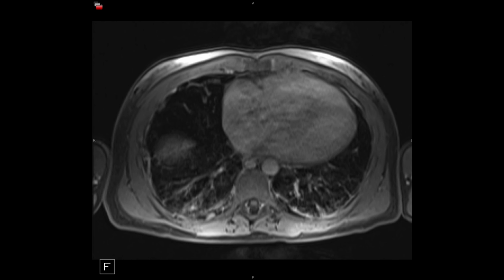And again, there's a gray zone, there's a spectrum of patients who have chronic PE, no pulmonary hypertension, but persistent symptoms, which is an entity known as chronic thromboembolic disease, versus the patients who truly develop pulmonary hypertension from chronic PE. And in those patients, you're going to see peripheral or these sort of eccentric filling defects within the pulmonary arteries. They may calcify over time. You'll see webs. You'll see vascular pruning. In other words, fewer vessels in a segment of the lung than you would expect. Mosaic attenuation. If you do perfusion imaging, you'll see perfusion defects. And, of course, the evidence of pulmonary hypertension within the cardiac chambers.